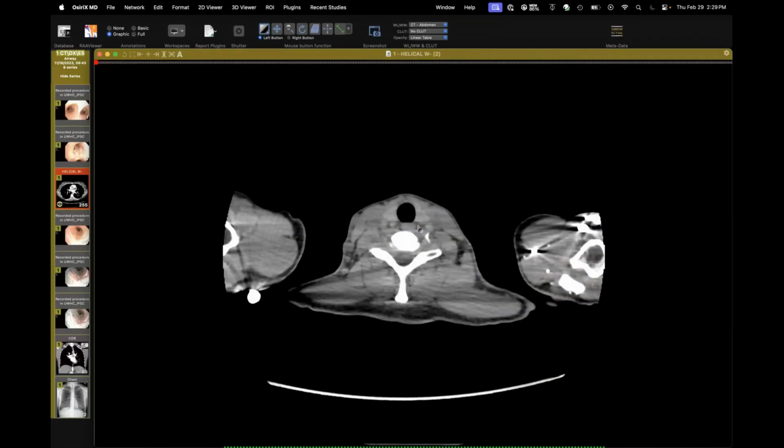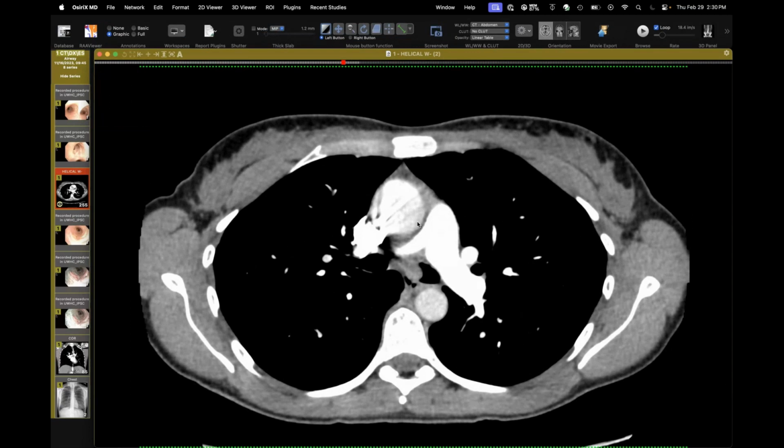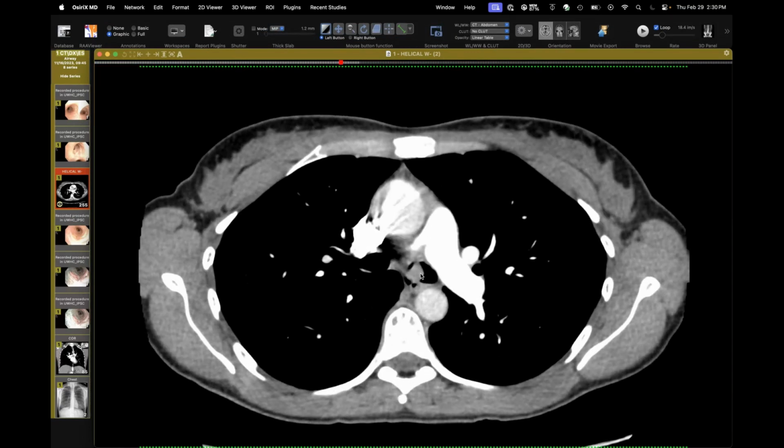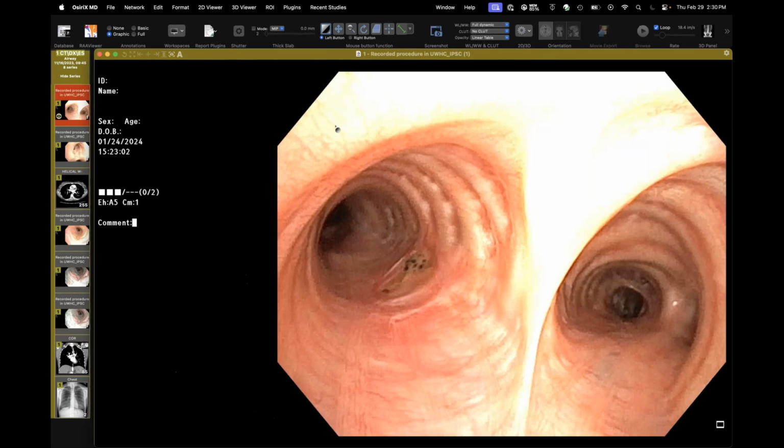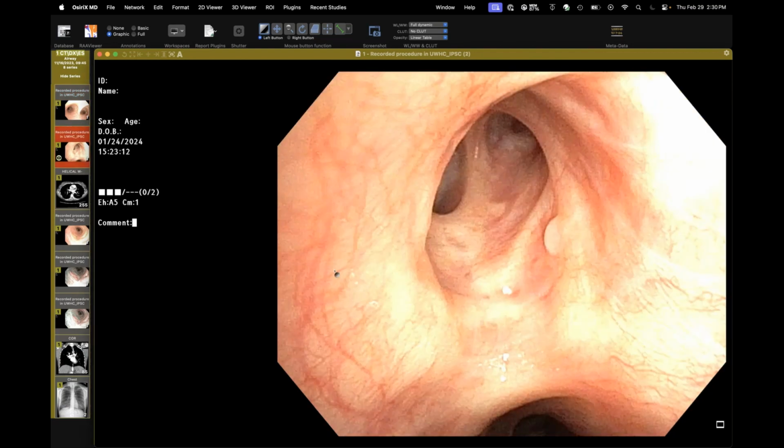Now, this patient did not have melanoma, but presented coughing up blood intermittently, and she had this cough. On CT, we found this endobronchial lesion, and they went in with their bronchoscope. We were thinking squamous cell, things like this. It had actually popped off; when they put their scope in there, it just dislodged, but they were able to retrieve the tumor mass. You can see what's left of the airway here, a little bit of it there. This was another inflammatory myofibroblastic tumor.